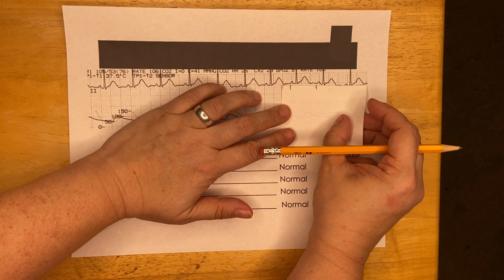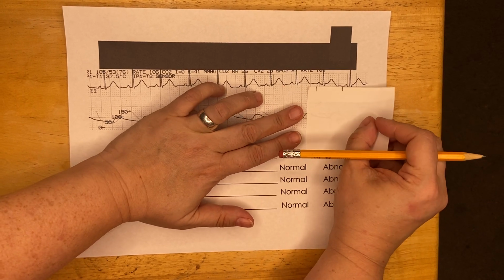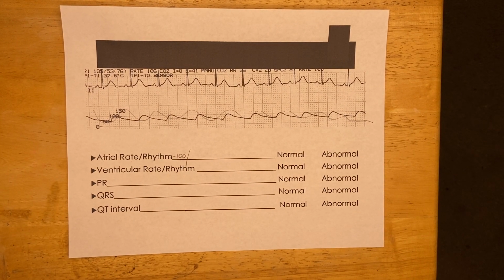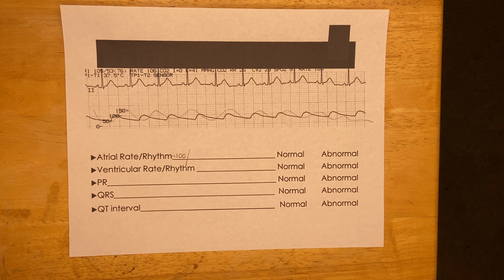This is one way that it's really helpful. If you're seeing little bumps that you aren't sure if they're P waves or not, you can start measuring out some waves that look the same and see if they're equidistant. If so, they probably are P waves, because the SA node is pretty good about firing uniformly at a uniform rate. Again, there are possibilities like sinus arrhythmia, in which the SA node speeds up and slows down based on changes in intrathoracic pressure with the respiratory cycle, but most of the time the SA node is going to fire pretty uniformly. So this is a good screening tool.